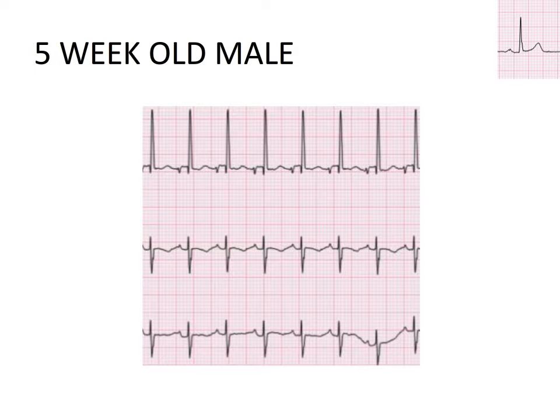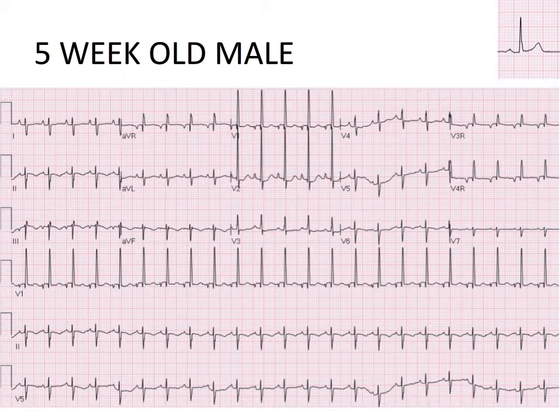Use this enlarged version of the EKG to calculate the PR and QTC intervals. You should have found that the PR is about 150 and the QTC is 401 if you use 6.5 small boxes for your QT and 10.5 small boxes for your RR. Now take a minute to look at the morphology.